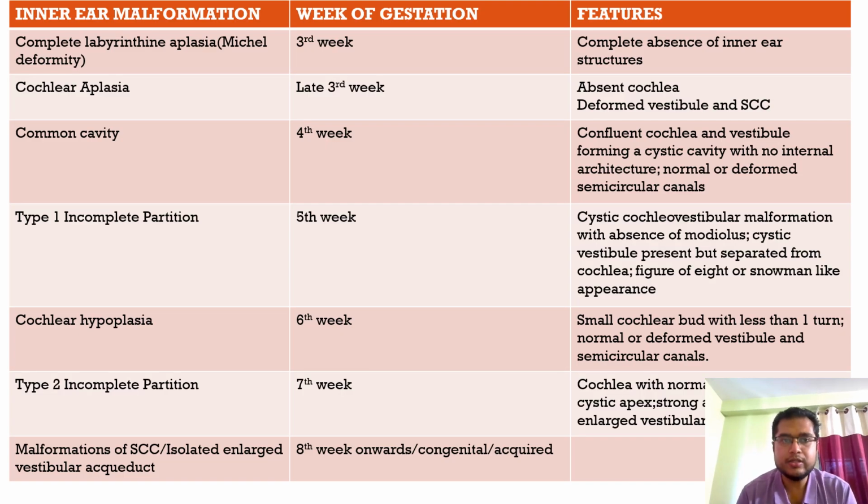So this is a list of all the inner ear malformations that we come across in our clinical practice. And it's very important, particularly if you are practicing in a place where cochlear implants are being done frequently, or even for your exams, where so many spots are asked from these particular entities. So what I just showed you was actually Michel deformity or Michel aplasia. This is the week of origin of that particular malformation, and there is complete absence of the inner ear structures.